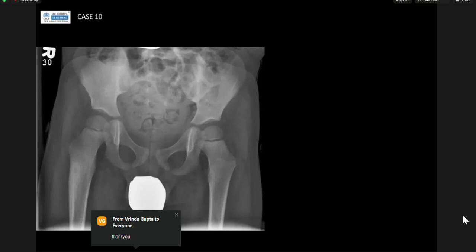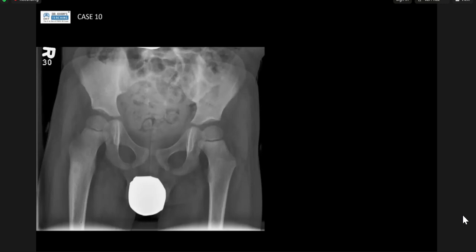Okay, good. The lucency, I'm not sure whether I'm overcalling, or is it a lesion in the femoral neck? I suspect, are you talking near the greater trochanter? Yeah, I think that's projectional. So tell me, what would you expect to see on the MRI?